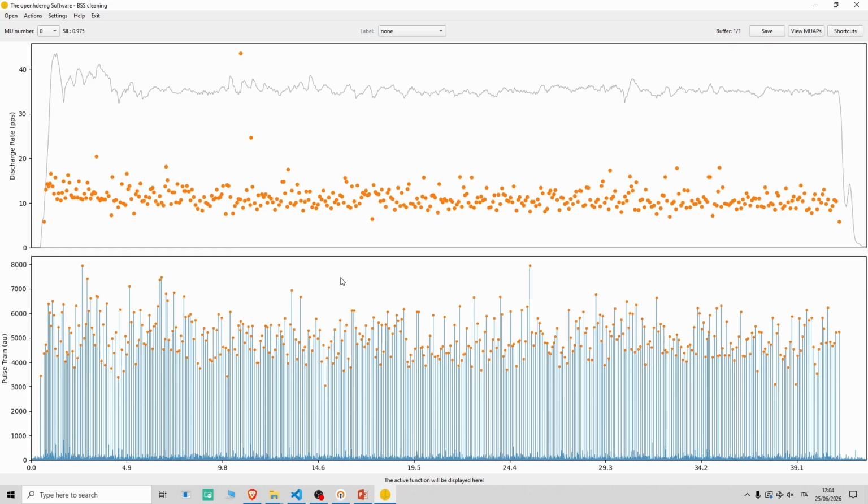And which is, by the way, the key feature of the cleaning interface. As you can see here, there are no buttons. I mean, apart from changing the number of motor units and assigning a specific label that we can customize to the motor unit if we need it, but there is no button. So to add, delete firings, change motor units, and zoom in and zoom out, all that we do is done through the keyboard and through the mouse.